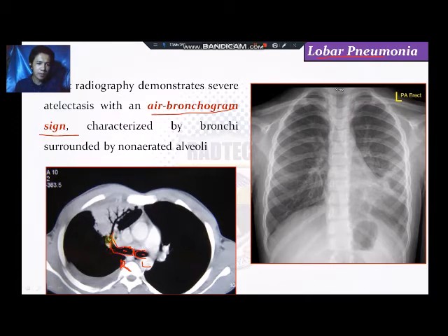Itom, because it is filled with air, no? That means the bronchial system is still open. Pwede pa gid siya agian og hangin. Okay, so the problem is yung ilang terminal nga portion. Pag abot na dito sa alveoli, dili na makapass through ang hangin. So that's why very dark ang appearance sa atong bronchial system. Kaya dito nagtapok ang hangin.